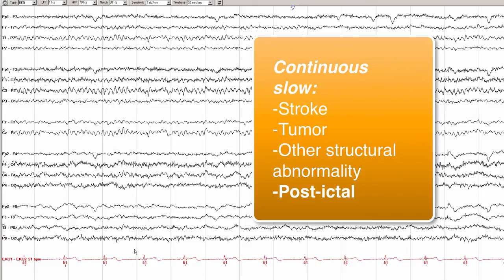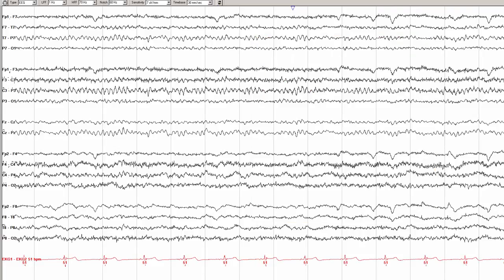For example, if a patient comes in with unexplained decreased consciousness, has normal imaging and a normal exam, but has focal polymorphic delta activity, it could be that they had a seizure prior to the EEG being connected. This is actually the case in this patient scenario. This patient had completely normal neuroimaging, but had unexplained altered consciousness, and it was later found that this patient had localization-related epilepsy arising from the right hemisphere. After 24 hours, his EEG normalized, and he has been well controlled with no further seizures while taking anti-epileptic drugs.